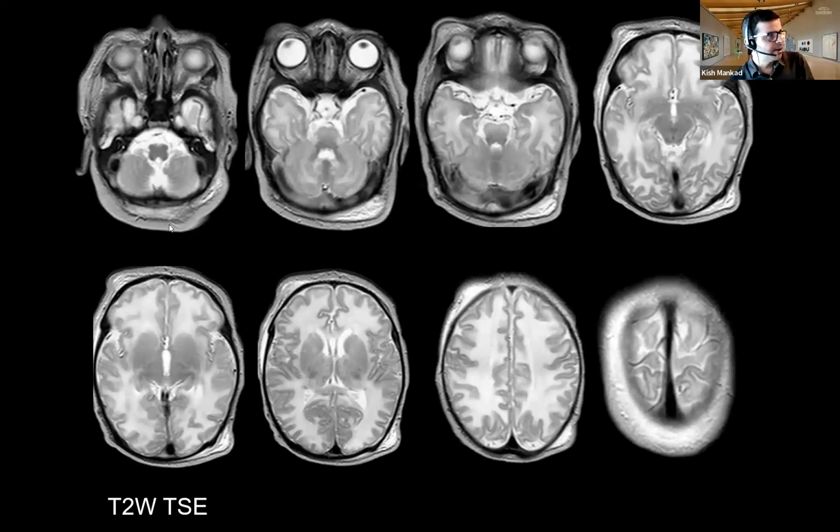I did talk to you a little bit about the pitfalls of MR imaging, and when you are in a neonatal situation, and I've told you, and I'm going to completely disappoint you by saying that in neonates you can get prominently large venous sinuses and you can get a signal like this on particular sequences, which is patchy, heterogeneous, and at different time points it looks different. These are flow-related changes. This is flow-related phenomena, and it is the turbulent flow of the blood within these slightly dilated channels that causes these flow-related artifacts.